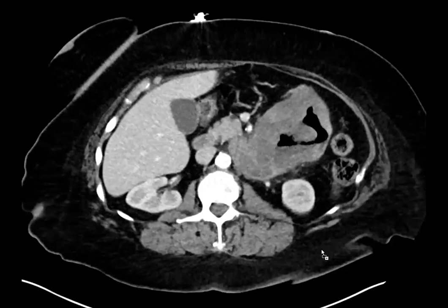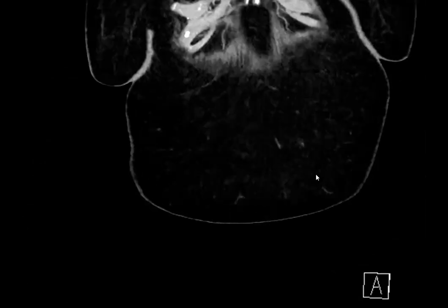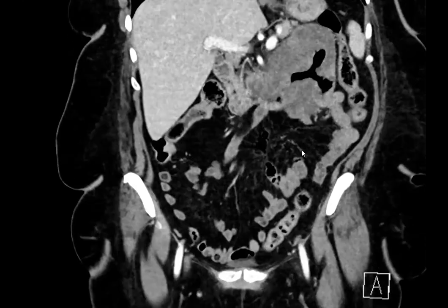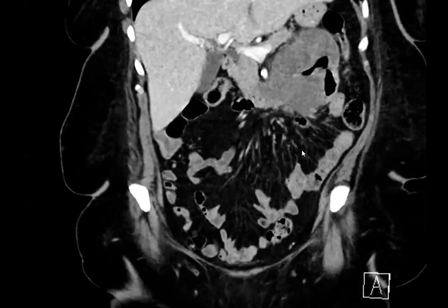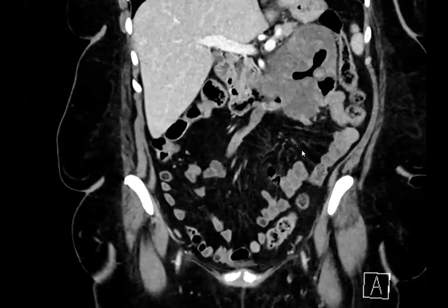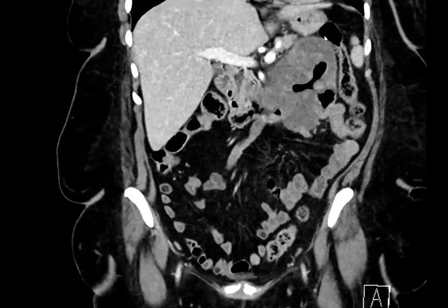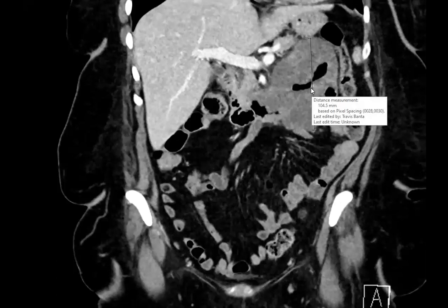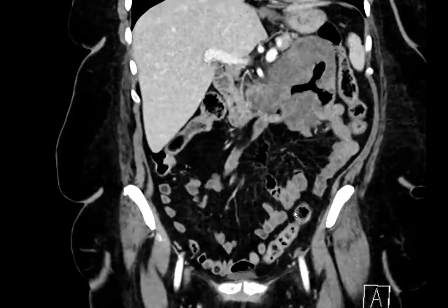I don't know if it's coming from the adrenal. No, it's too anterior. This can be an endocrine tumor. Okay. Neuroendocrine can be anywhere in the GI tract. That's an excellent thought. Usually when they're in the small intestine, they are small, tiny multifocal tumors with a nodal metastasis. Most commonly, the primary tumors are in the ileum, appendix, or rectum. So jejunal neuroendocrine is more rare, but good, excellent.